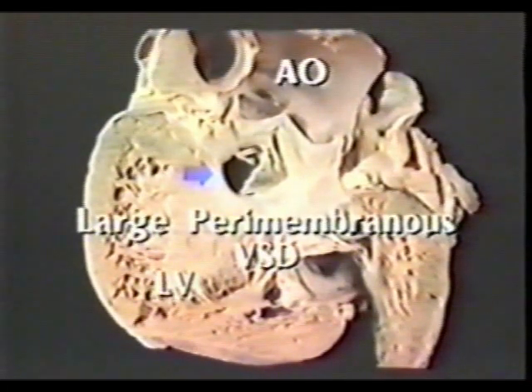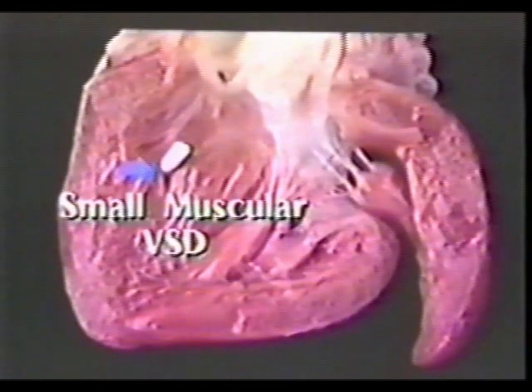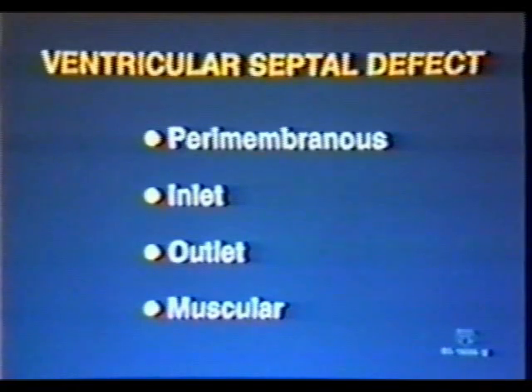Ventricular septal defect is relatively infrequently seen in the adult practice. When seen, it is either a small defect or a large defect with resultant pulmonary hypertension. A simple and practical classification of ventricular septal defects is shown here.